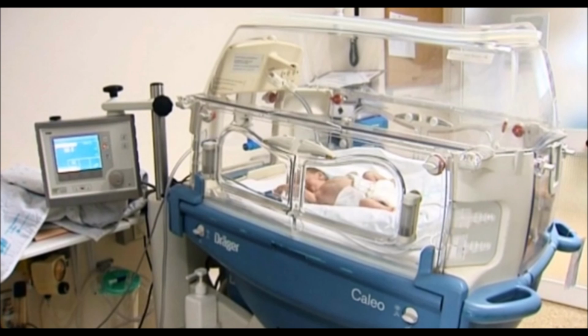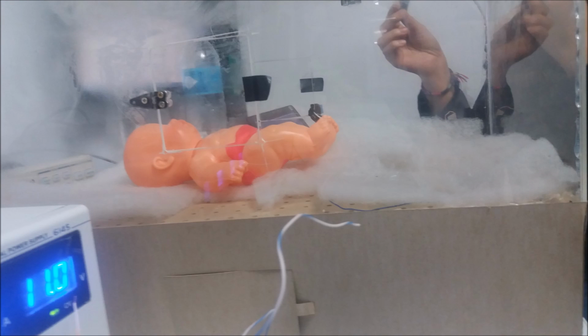An infant incubator is a piece of equipment common to the pediatric hospital, birthing centers, and neonatal intensive care units, while the unit may serve several specific functions. The incubator serves almost as an artificial uterus, creating an optimal environment for the newborn. There are several important aspects to take into account in the operation of the incubator and its effect on the baby.